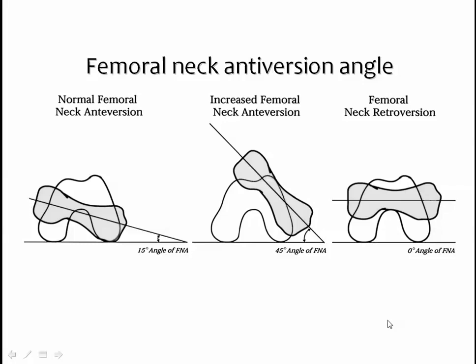This is MRI sagittal view showing too many loose bodies within this hip, which contains a lot of fluid also due to effusion. And finally we came to the femoral neck anteversion angle, and you know that there is a small angle between the femoral head and the horizontal plane, and this diagram shows the anteversion angle of the femoral head in relation to the tangential line to the femoral condyle, and this angle is in the range of 15 degrees according to the age of the patient.